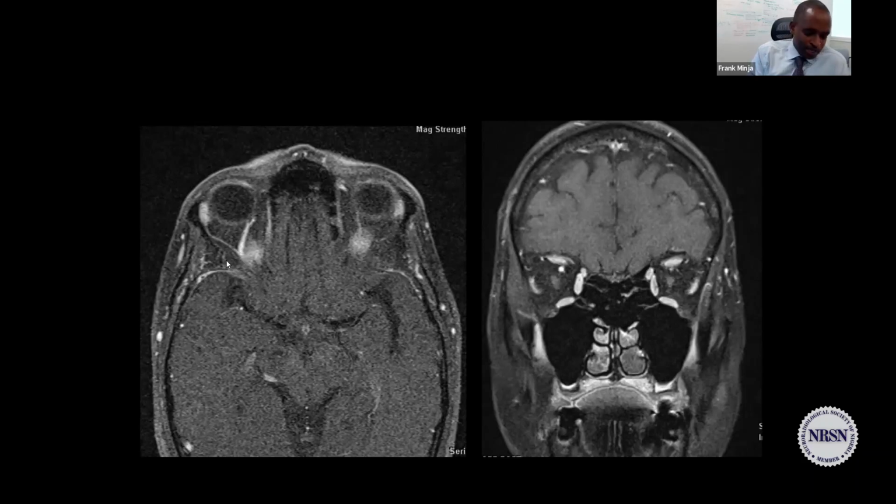That's your clue. We talked about CC fistula. Awesome. CC fistula, right? Cavernous carotid fistula. Indirect or direct, right? I'll tell you, there's no history of trauma. So what are we thinking here? Is it going to be direct or indirect? If there's no trauma, is it a direct CC fistula or indirect CC fistula? Indirect. Awesome. You guys are like, right?